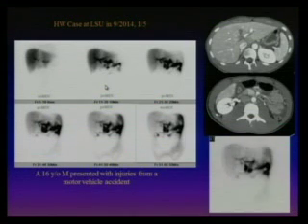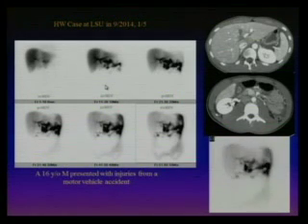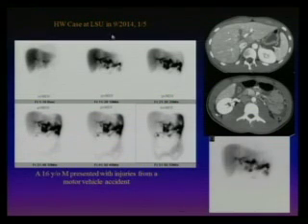And then, of course, the question is you need to tell me where the leak is. Based on where the leak is, you know the leak type, and based on that, you decide what kind of surgery you do. Can you tell where the leak is? Maybe in segment 4, but it looks like it could be more than one spot. When you get this cine image, you know the leak is eventually going into the abdomen everywhere.